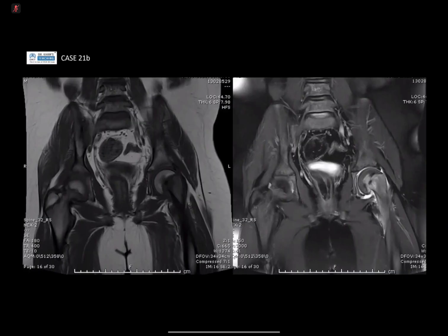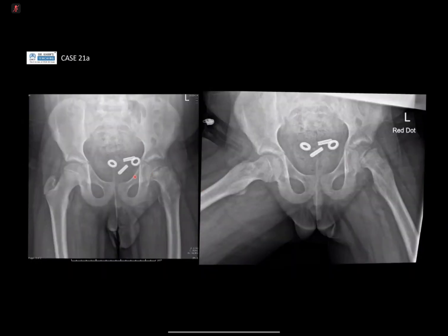Okay, so you've got another MRI that was done. Does it confirm or refute your diagnosis? Yes, it confirms the femoral head epiphysis is subluxed posterior medially with joint effusion, and findings are suggestive of slipped capital femoral epiphysis. Yeah, good. So exactly what you said. There's asymmetry of the physeal line. So you've got widening, sclerosis, and most importantly, you've got the slip, which is best identified on the frog lateral view. You talked about Klein's line. We'll talk about that in a bit.